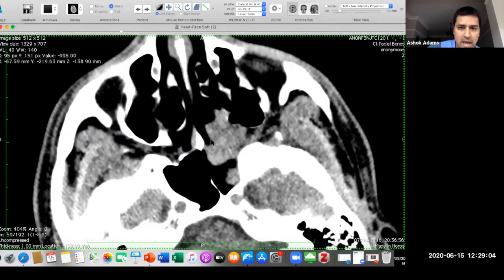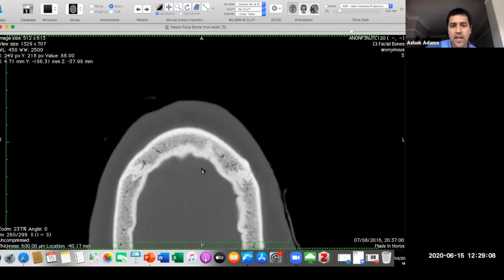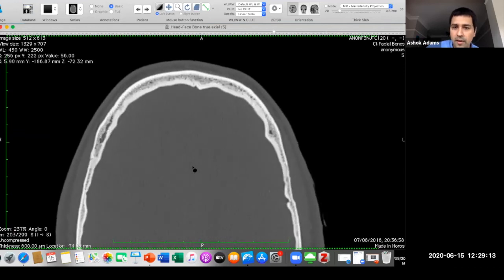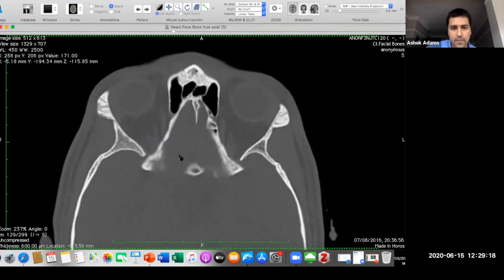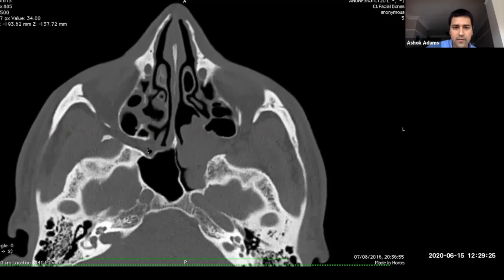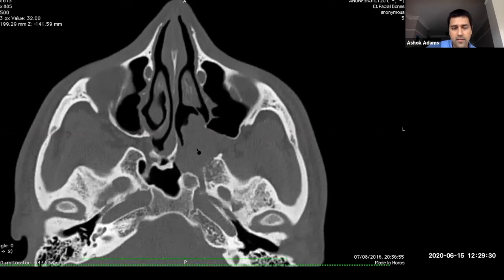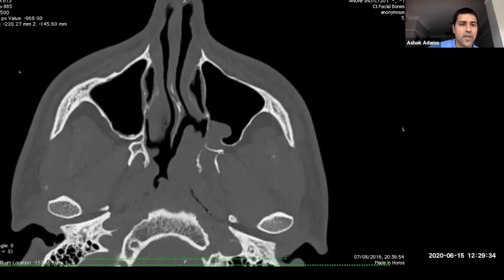And then just to recap, particularly if you've got a soft tissue lump or bump that's posteriorly located, again, looking at the bony structures, and particularly if you've got a young adult male patient with epistaxis, one of your check areas is going to be that sphenopalatine foramen. I'm going to show you what it looks like on the bone window here. So as you come further south, there's the pterygopalatine fossa, there's the sphenopalatine foramen, and you can see here abnormal soft tissue lump at that site with bony destructive change. So that was a juvenile angiofibroma.